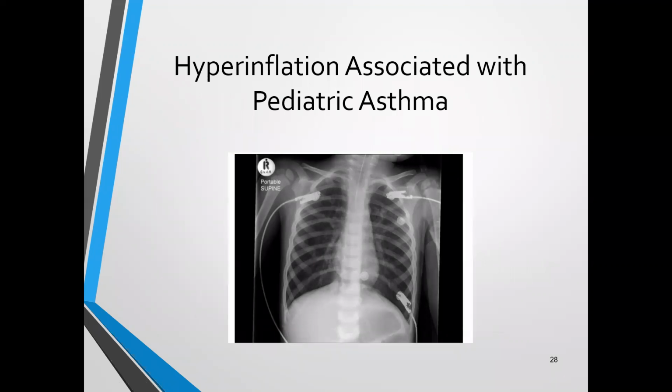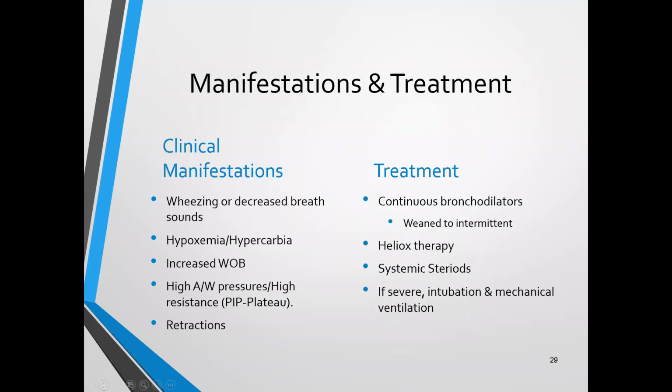Well, it does, but if I showed you this and then this pediatric patient 2 weeks later after they're out of this crisis, you'd see that the lungs don't look quite as big, with big rib spaces. There is some flattening of the costophrenic angles. So you're really looking at hyperlucencies, a lot of blackness there, a lot of air.